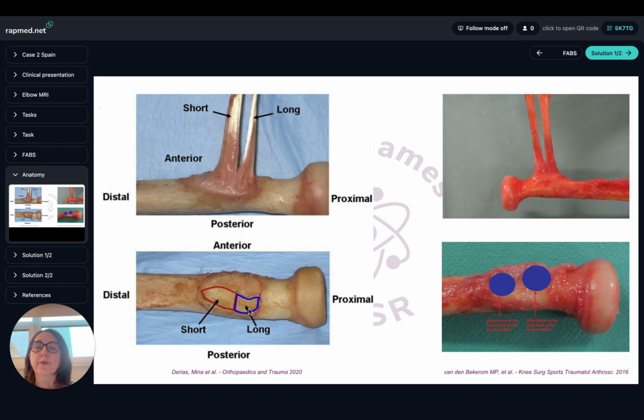to avoid missing some of the parts of the biceps tendon insertion. This is important because as we are improving our diagnostic skills, the surgeons are also improving and getting better at how to treat.